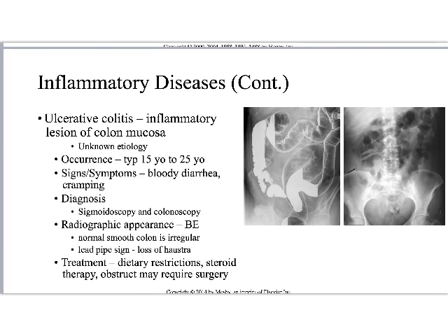Okay. Radiographic appearance on barium enema: it's going to be a normal, smooth colon, and it's going to now appear irregular, right? So where the colon was normally smooth, now it's going to appear irregular. You can see that in this area right here. That whatever that is really ticked off.